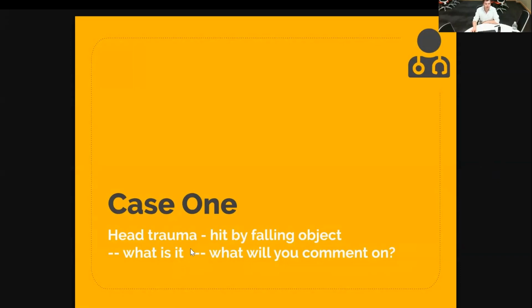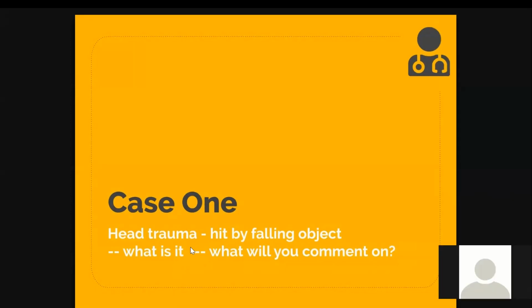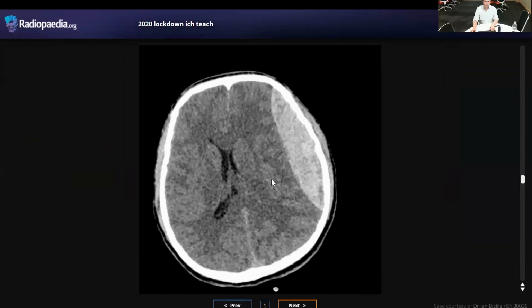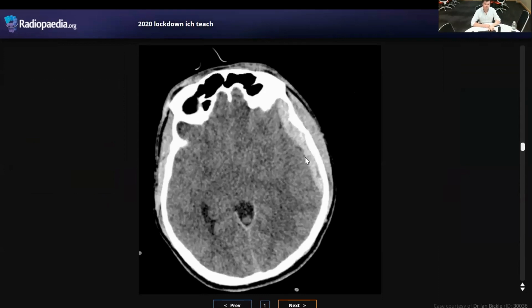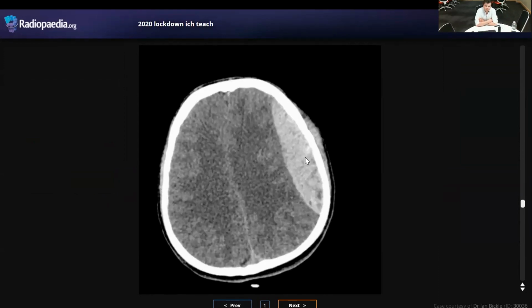Do I have a willing volunteer to take the first case? Sure, Derek. I'll take it. That going to be yourself, Mason, right? Let's see if this works. So remote control. So Hassan, right. You should be able to hit a button and then you should be able to get control of the mouse. All right. Tap here to control Derek's screen. Nice. There you go. So you'll be able to scroll with the middle button on your mouse if you got it, or press up and down on the keyboard. I'm just using my iPad. Oh, that works, yeah. All right, I see. It's quite nice.